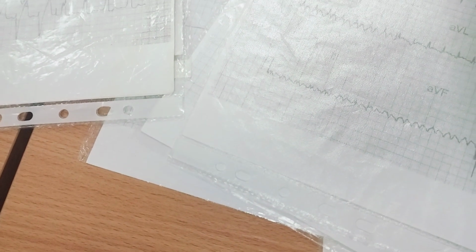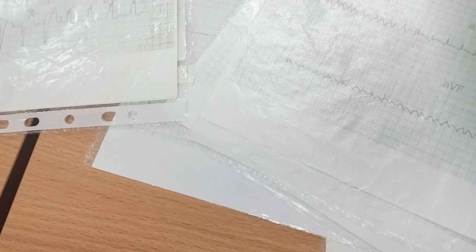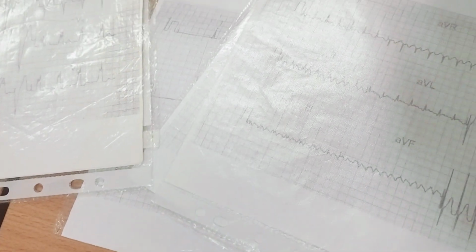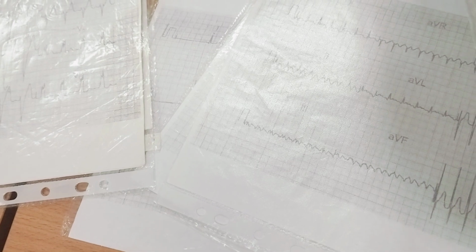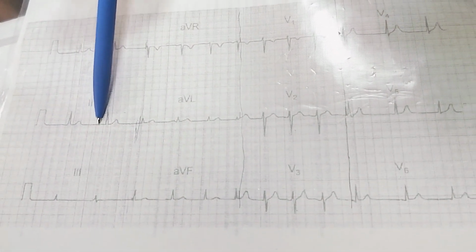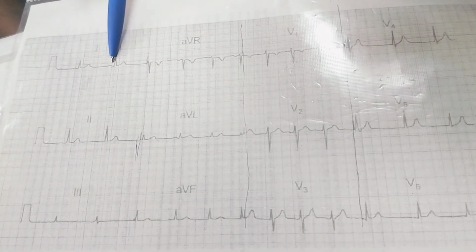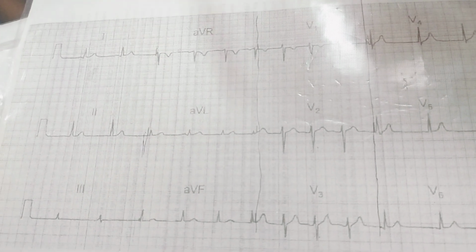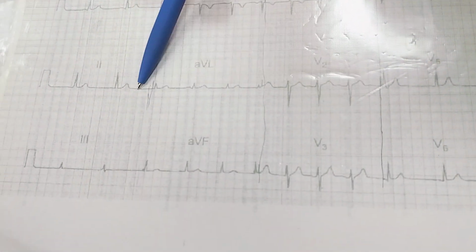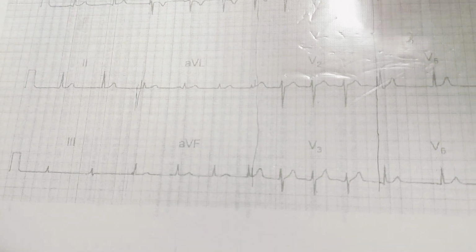So do you have a normal ECG? For what? We don't need... No, normal, I mean to compare. This one is close to normal. But the second lead is without P waves, but this one may be a P wave, but no, P waves are absent everywhere. Except for P waves, it is a normal ECG.